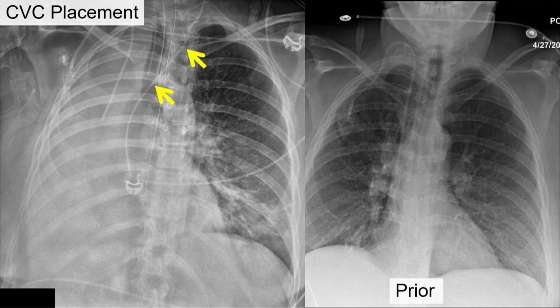under controlled circumstances. This was a patient with a lung cancer. The cancer had progressed. He had complete collapse of the right lung. At some point, I think during one of the rounds of chemo, they got septic. They had a pneumonia here on the left. They had a pre-existing right-sided port catheter, but because of sepsis and need for circulatory support, a left-sided catheter was placed and was coming down here.